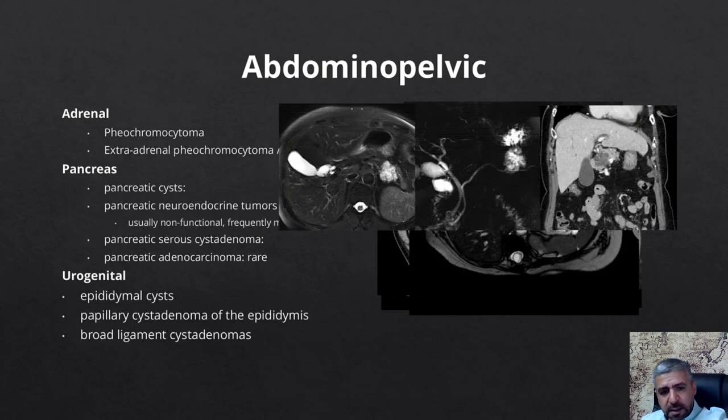The pancreatic serous cystadenoma is a benign tumor composed of multiple small cysts. Here, as you can see, this is the pancreas, and it's in the body/tail of the pancreas. This is the maximum intensity projection, or MIP image, of the case, and in the CT scan you can also see here in the head of the pancreas, in another patient, multiple small cysts, suggesting pancreatic serous cystadenoma.